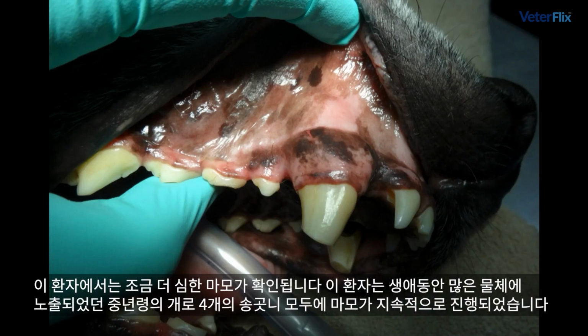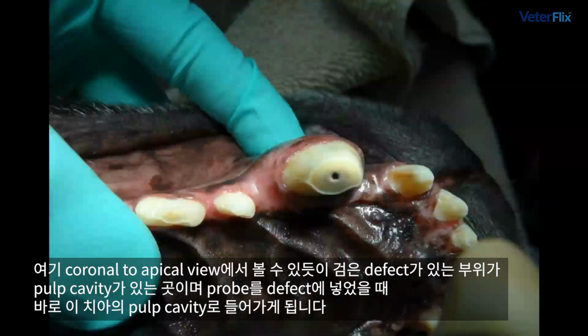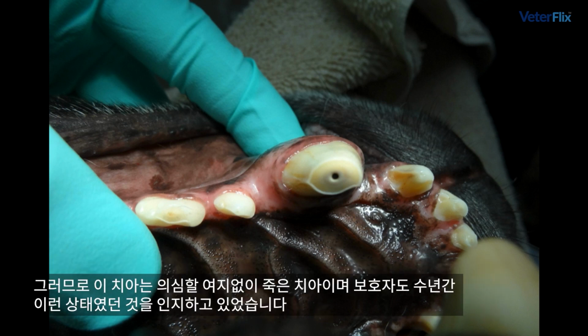In this patient, we've got more severe wear. This is a middle-aged dog that had access to many different things over its lifetime and has very contiguously worn all four canine teeth. You can see here, looking at the coronal to apical view, that there's a black defect where the pulp cavity is, and you can actually take a probe, place into that defect, and go right into the pulp cavity on this tooth. So there's no doubt that that's a dead tooth.